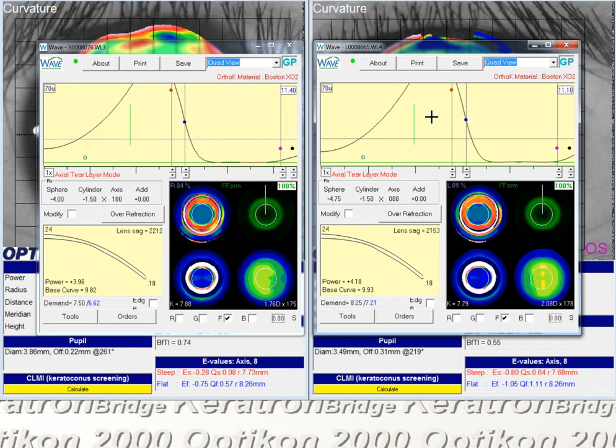So up around that amount of clearance, it's very likely that we'll see bubbles, and bubbles aren't always a problem, but in this case it does seem like the patient's not getting enough molding in the vertical meridian. So if we want to decrease the maximum clearance underneath the lens while maintaining the same topo demand, the only way to do that is to either reduce the OZ size or to add asphericity. And in this case, in the vertical meridian, we're already working pretty small. I think we're 5.6 and 6.2.